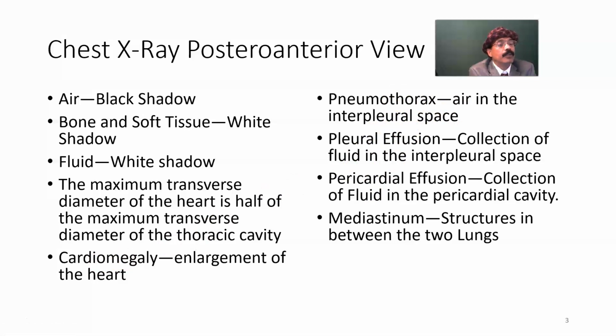Lung infection, maybe due to tuberculosis. Pericardial effusion: collection of fluid in the pericardial cavity, usually slow collection, maybe due to tuberculosis or other autoimmune causes. Sometimes we don't know the exact cause. It may be a complication of rheumatoid arthritis, or also rheumatic fever, or a complication of open heart surgery. Mediastinum, what is mediastinum?